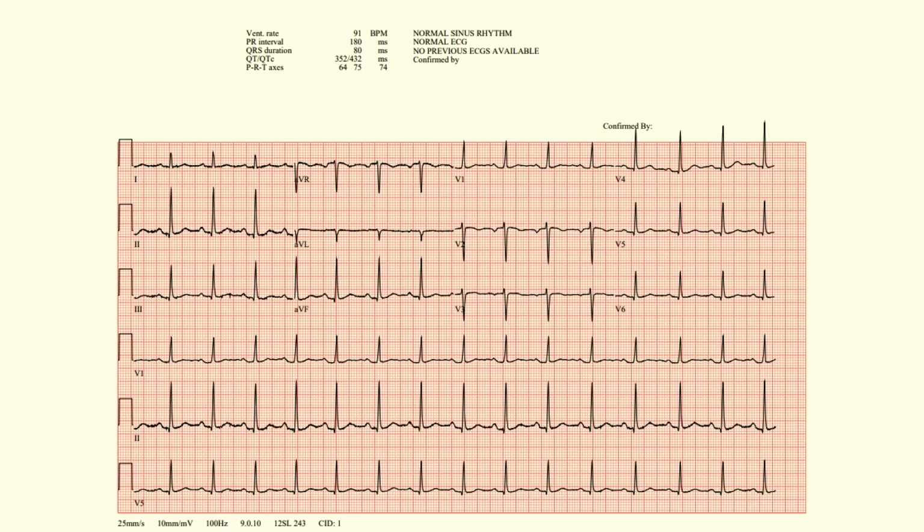All right. Now, any problems with this ECG? I picked this thinking it was completely normal when I first made this presentation, but I've iterated a few times since then. There's something up. Yeah, what do you think is going on? Kind of a weird R wave progression.